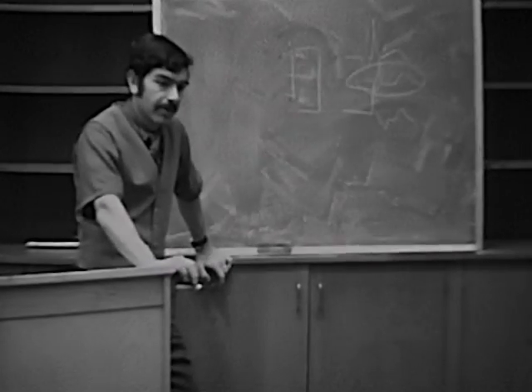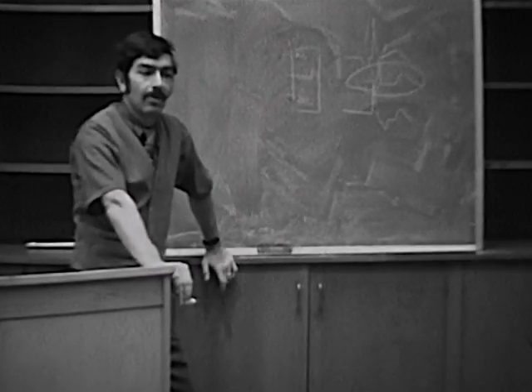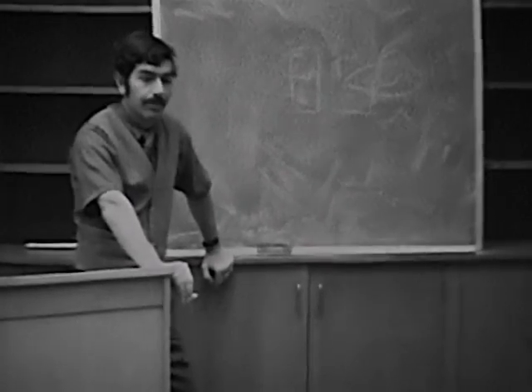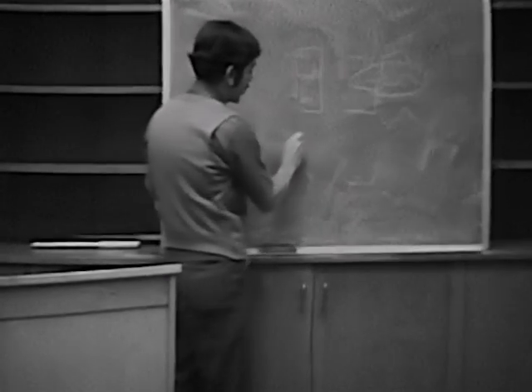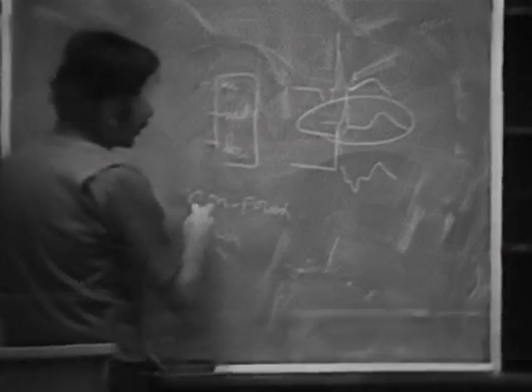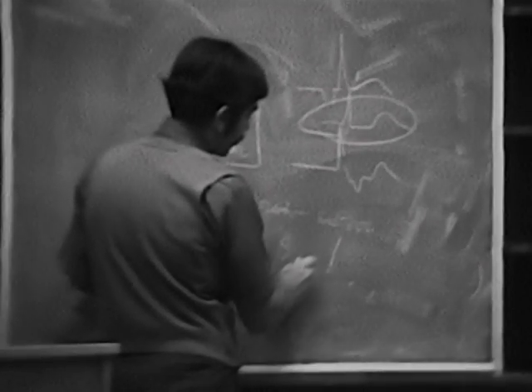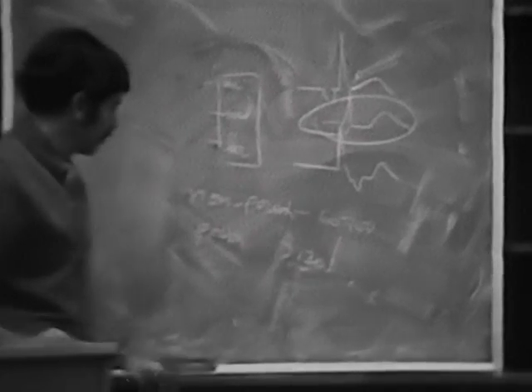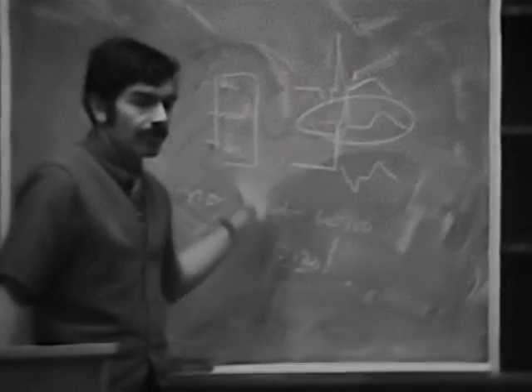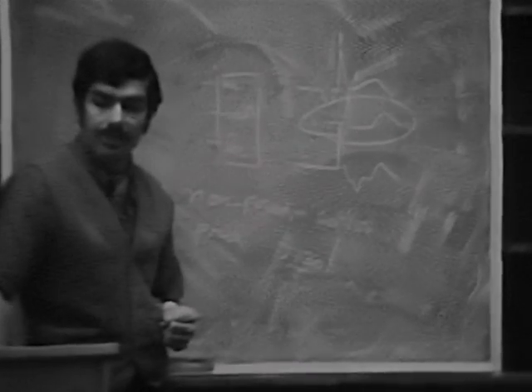Irritability of the node, increased excitability. You can have the node escaping at its own intrinsic rate. You can have nodal tachycardias. Right? Nodal tachycardias are usually divided into two types, what they call the non-paroxysmal nodal tachycardias and the paroxysmal. The non-paroxysmal usually have rates of about 60 to 100, and the paroxysmals usually have rates of greater than 120. I think it's greater than 120. So these are your slower ones, and these are your faster ones. And both of them are frequently associated with digitalis intoxication. Probably the most common cause of both of these nodal mechanisms.